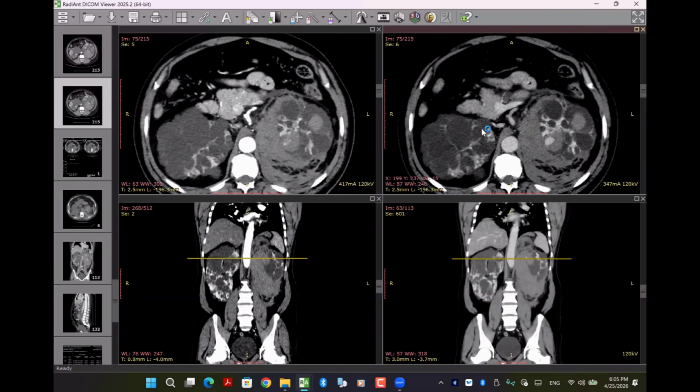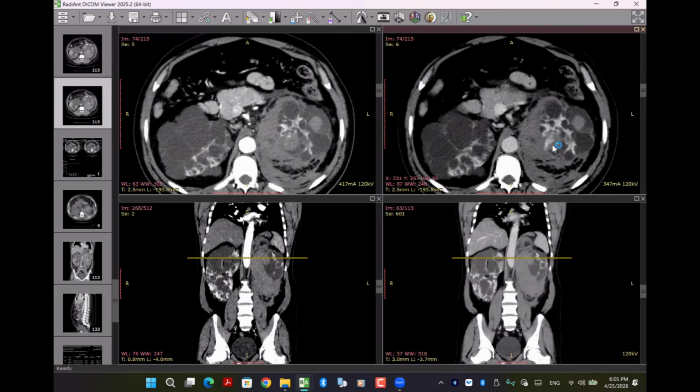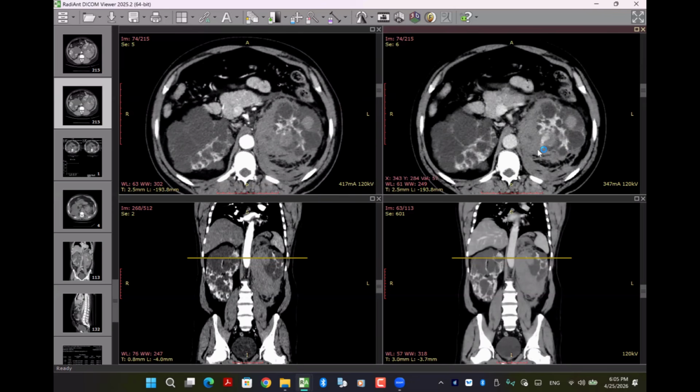But you did it very well. You stated already this could be hemorrhagic cyst rupture or even intrarenal aneurysmal rupture. What else do you know about this polycystic disease? They have a specific type of aneurysm. They are known to have 20 to 30% patients with a berry aneurysm in the brain. So after stabilizing the patient, I will advise a cranial CT angiography. Exactly. We should screen the cranial vessels to check for another possibility. What else can be missed in this scenario?